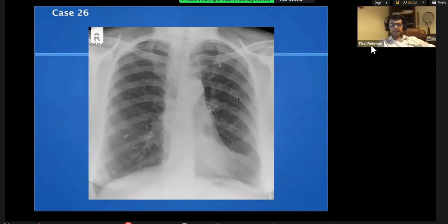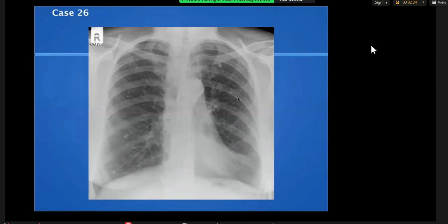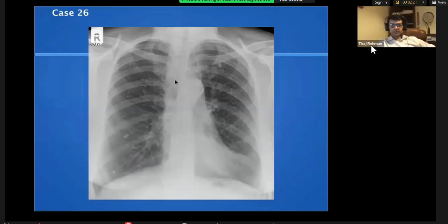So what is this X-ray showing? Scattered diffuse pulmonary nodules of varying sizes with random distribution, no zonal predominance. What is the density of the nodules? It's hyperdense, almost isodense to the bone. Yeah, to the calcified nodule. So diagnosis? Diagnosis includes previous viral infection with calcified granuloma. This is varicella pneumonia. The appearance of multiple calcified nodules.